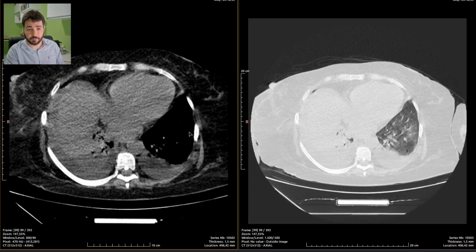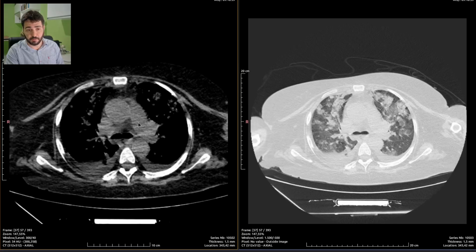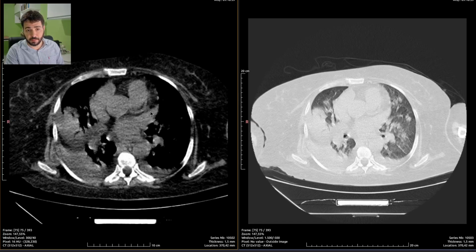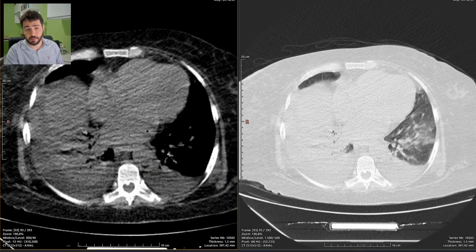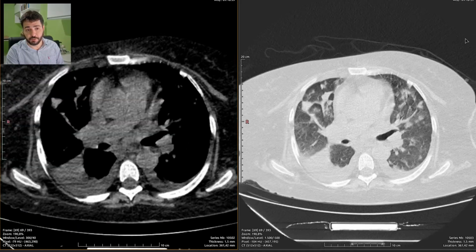So I have some atherosclerotic changes, really mild atherosclerotic changes. Most probably I also can tell there is some kind of coronary atherosclerotic disease right here. The heart seems enlarged. It might not be, but I'm going to report as if it was.